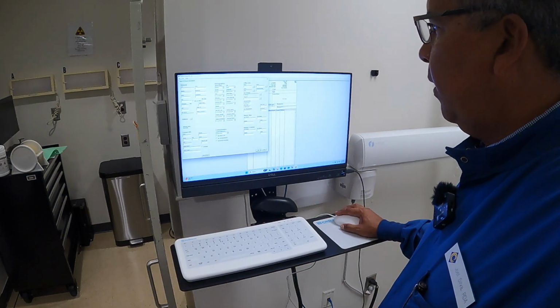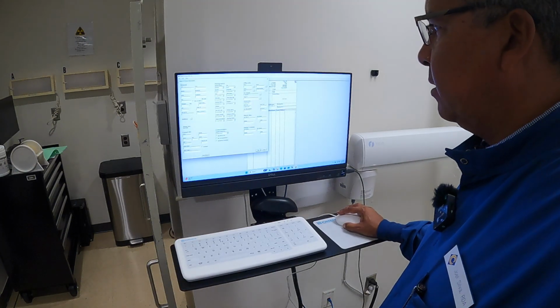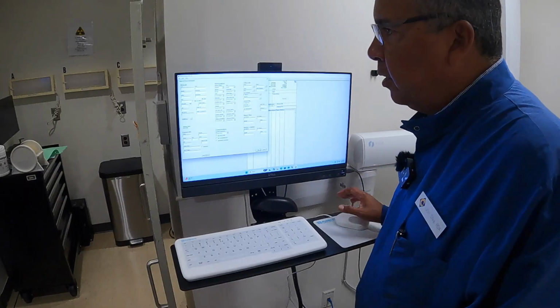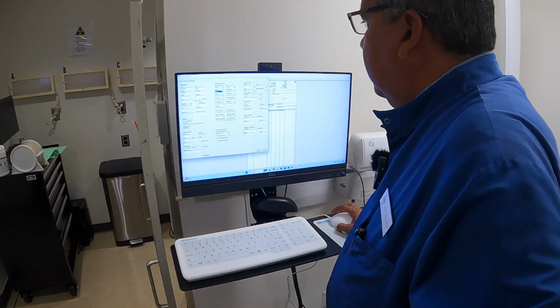Okay, so I'm going to go ahead and just let you fill this thing out, and I will go over this after all that, because this takes a little extra tutorial on there. So go ahead and complete the personal, contact, and demographics. Okay.